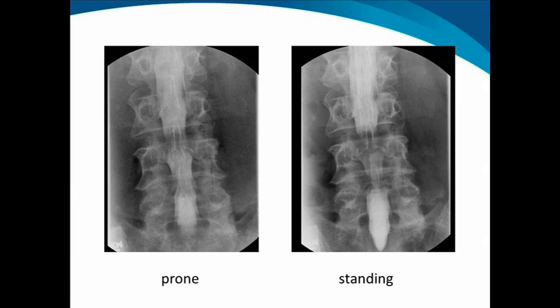On the left, you have a prone myelogram showing mild thickening of the nerve roots, slight redundancy of the nerve roots, but essentially no myelographic block. Contrast can pass across this area. When the patient stands, there's a clear myelographic block with the contrast above the level of stenosis unable to pass the stenotic L3-4 level. Certainly the sine qua non of significant stenosis.